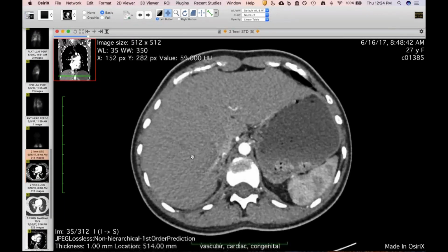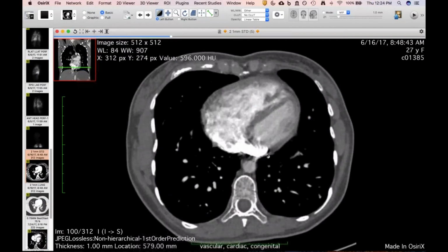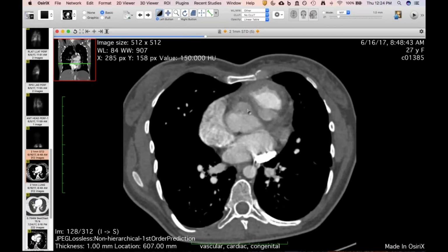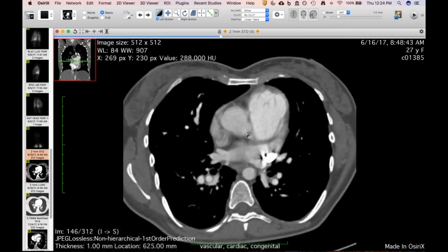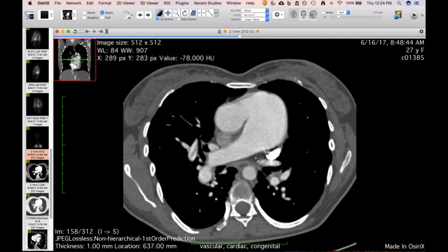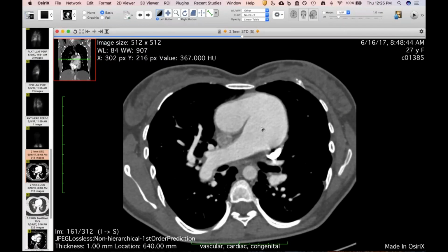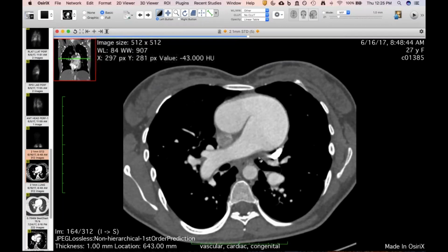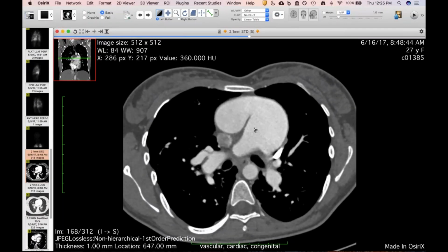This was last year's CT. And I can't remember if anyone's shown one of these in an adult or not. You can see that the right ventricle is enlarged and hypertrophied. And so she certainly looks like she's got pulmonary hypertension. We'd think about a shunt in somebody of this age. And here is the shunt, that she has a huge congenital AP window or aorticopulmonary window, so untreated, and now has massive shunt vascularity and pulmonary hypertension as an adult.